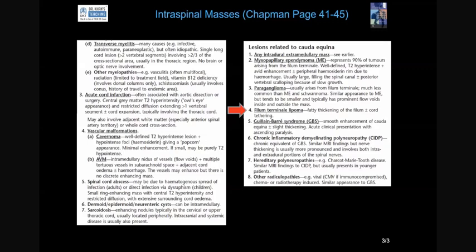If the conus is distally located, then this is what cord tethering is. In cord tethering, it is not plastered to the posterior elements. It is actually pulled downwards. So please remember that. There is a bit of traction and pull.